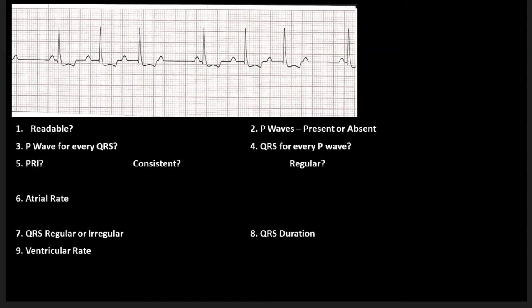Our first thing is, again, as with every EKG, we want to know whether or not this is a readable strip. And if I take a look at this, I can identify waves. I don't have any real abnormalities here, so I'm going to say that, yes, this is a readable strip.